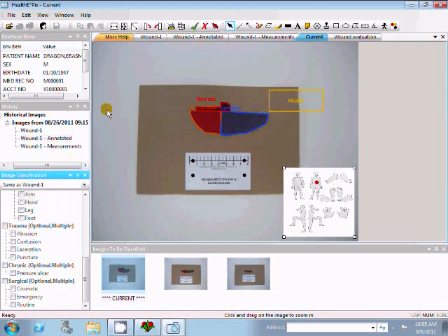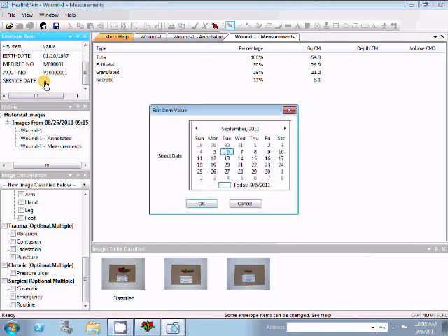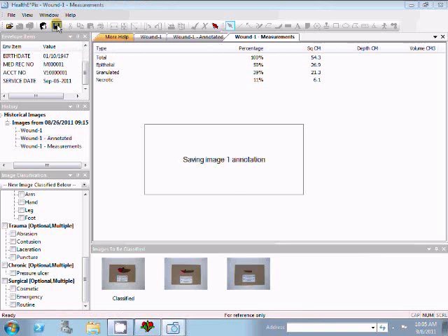After I classify an image, I can do another one for this same patient. It might be another picture of the same wound, or it might be a new picture of a separate wound. There's no limit to the number of pictures I can process for a patient. When I'm all done, I click the Save button, and since the program is in batch mode, it starts over with a prompt for the next patient name.